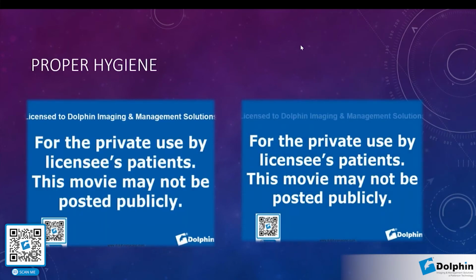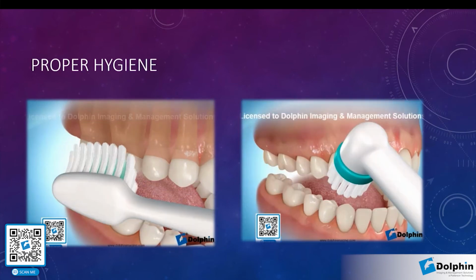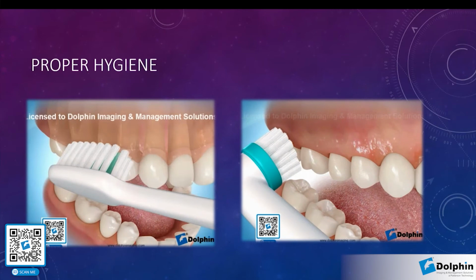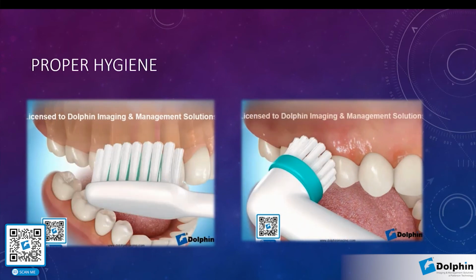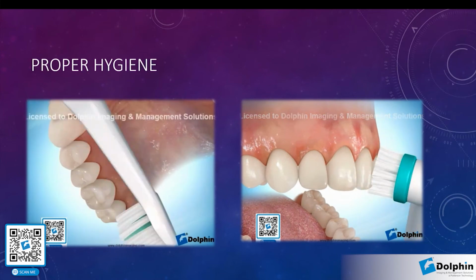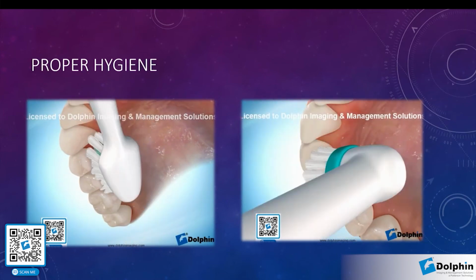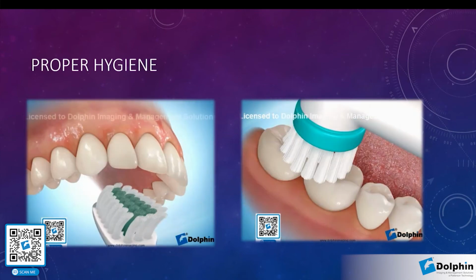And then you can do custom borders, really give it a nice presentation feel to it. And you can save this PowerPoint presentation, and you can allow the patient to view it at any time if you want to as well. So again, it's really just a limitation of your imagination.